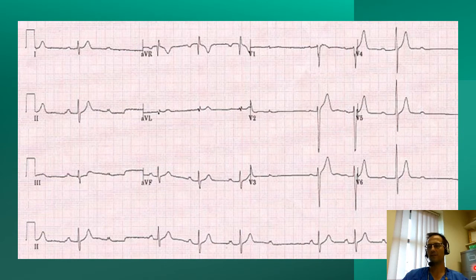So next up we have one of the ECGs that I think causes the most confusion. And this causes a lot of confusion with complete heart block. We have a narrowish QRS duration, so within normal limits, and we have clear-cut P waves, but we have lots of pauses. And we have more P waves than we have QRSs. And marking them out can be really helpful.